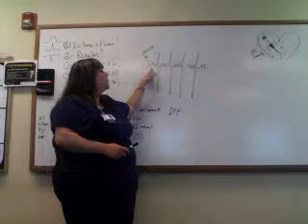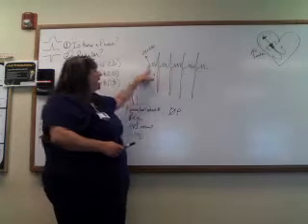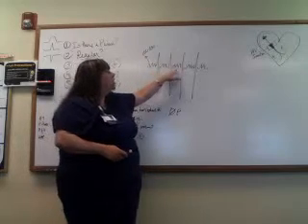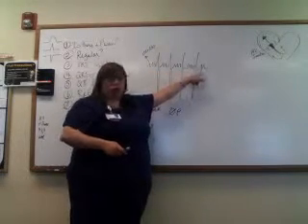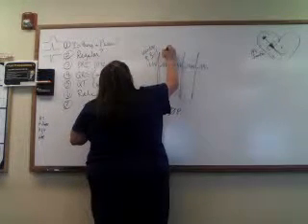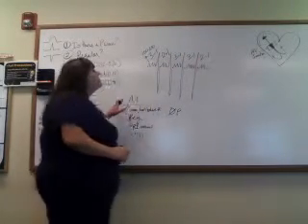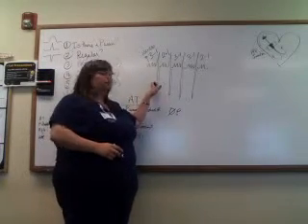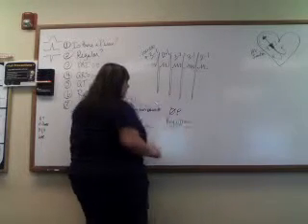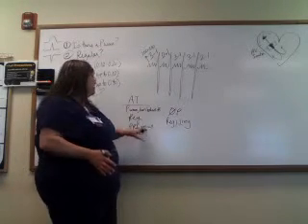So what happens in this one is you have more atrial waves than you have ventricular waves, okay? So in this case, you had 3 waves for this one, you had 2 waves for this one, you had 3, you had 3, you had 2, okay? So those would be considered conduction ratios. Okay? This is actually one class of rhythms that can be either regular or irregular. There's a second one that we'll talk about. But this actually is one class of rhythms that can be either regular or irregular.